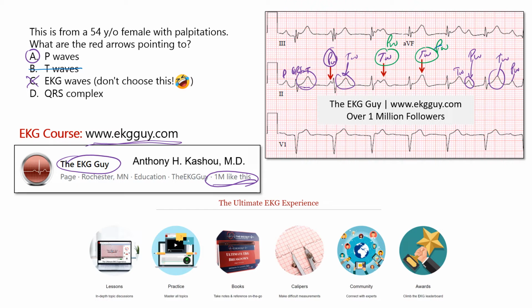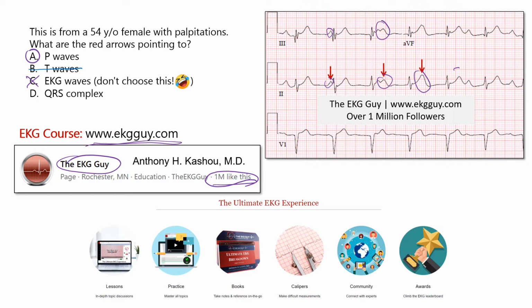You could also see that in the leads above it. So if we were to erase this to clarify some things, notice above, just like you see a P wave here, there's also a P wave there. There's a P wave here that's buried in the T wave, and the same thing above. There's a P wave buried in this T wave, and same in this one. And then you can see that we're back to normal T waves here.